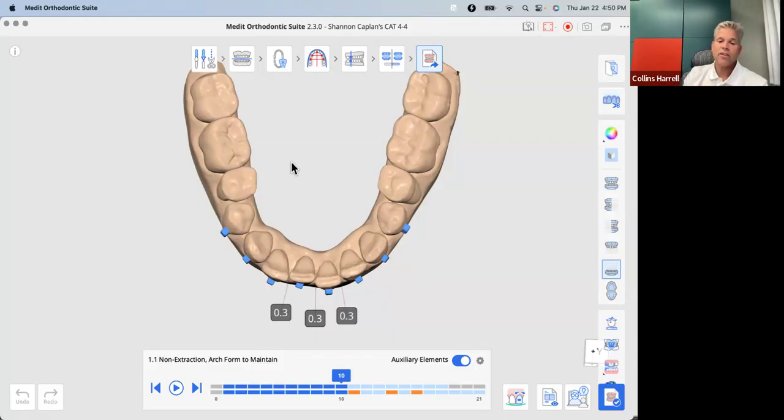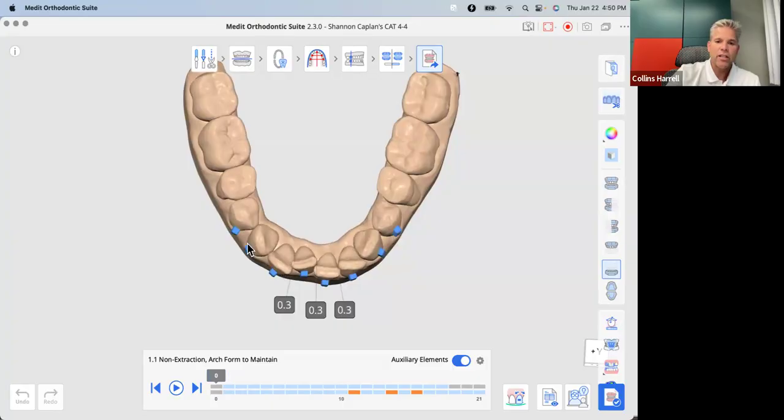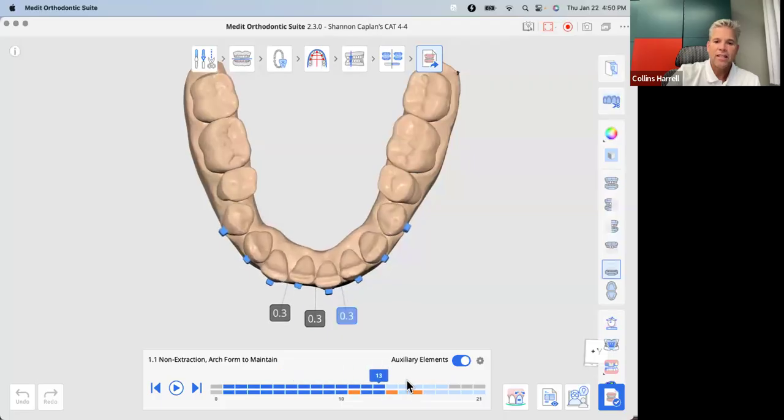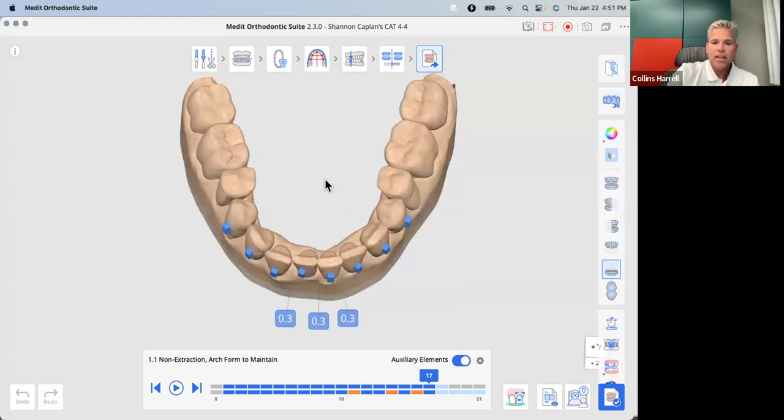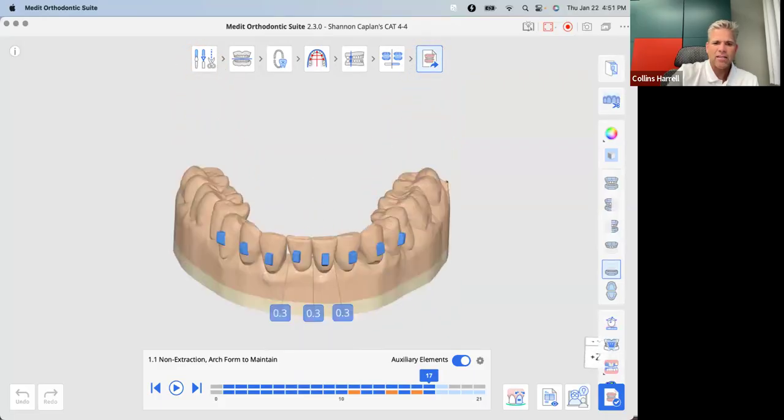That's a lot more efficient, effective way to do these aligners than trying to get these aligners, which initially had all this crowding and you don't actually see all these interproximal surfaces. And it allows you throughout this process to get better and better control of the teeth and have more control over the actual tooth anatomy so that you're getting that result you want at the end. Different way to think about cases. Does that make sense?